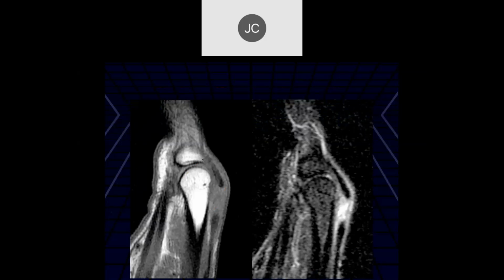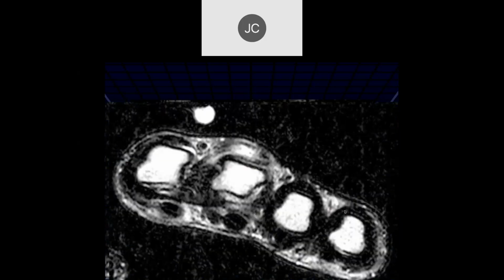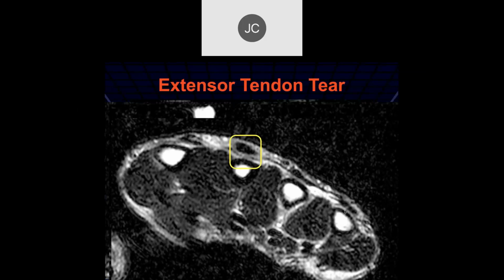Robert. All right, so you're looking at the extensor tendon. It looks like there's a frank tear kind of at the metacarpal head, yeah. Yeah, right. And this is a common type injury to see. There you see it, there you don't, and there you see it again. And these are usually from penetrating injuries where you get laceration of the extensor tendon. That particular one can be from hitting somebody.